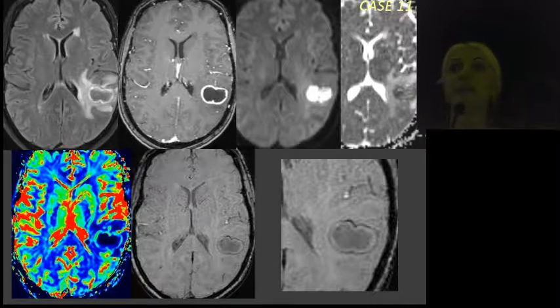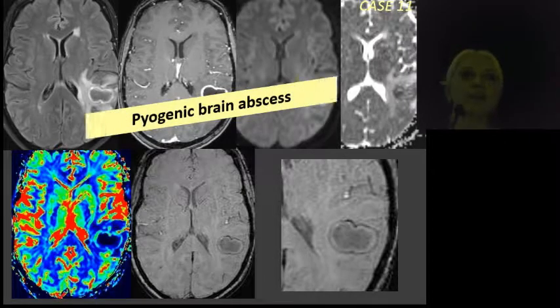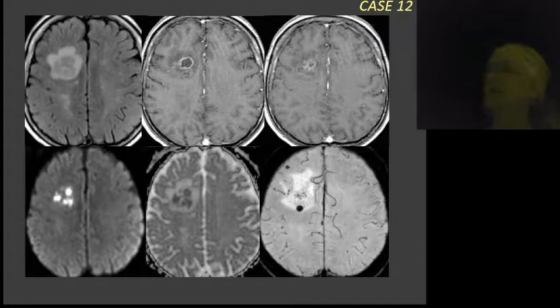No-brainer, where everything fits and it's easy. This is pyogenic brain abscess, right? This time everything fits. Okay, this is a case of an immune suppressed patient again.